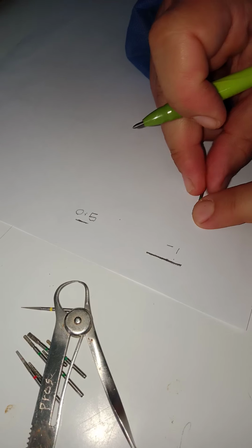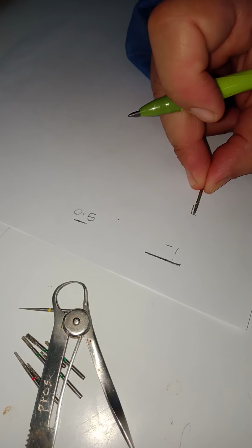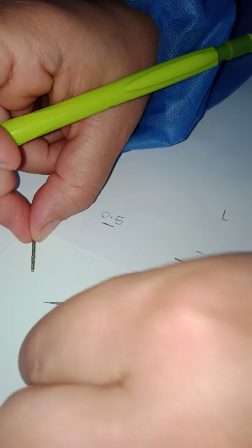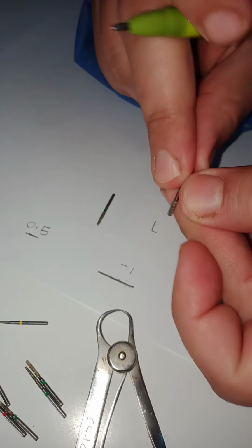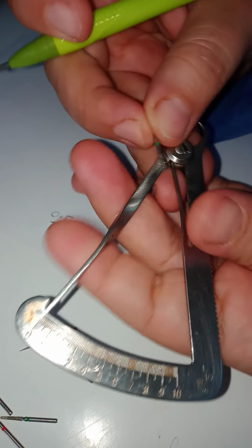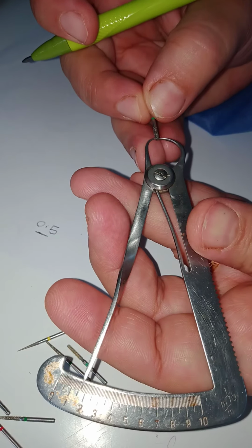But if the total bur is inside the preparation, that means I have created 1 millimeter, enough as a finish line. If I want 1.5, I use a thicker bur. See this? This is thicker. So if I want to make sure that I'm going to the correct thickness, gauge your bur. But later on you will have the experience, and you will know the burs by vision. But see, this is 1.5.